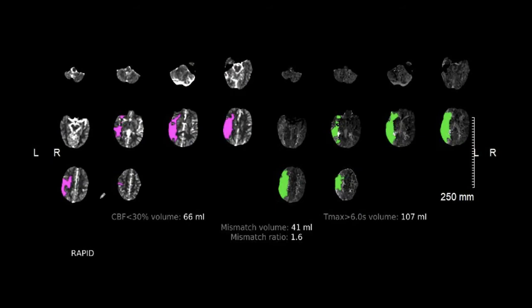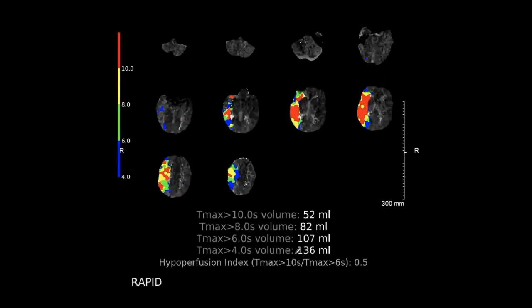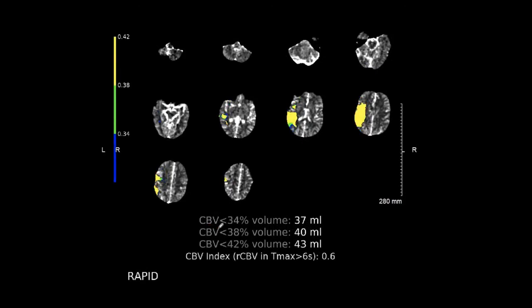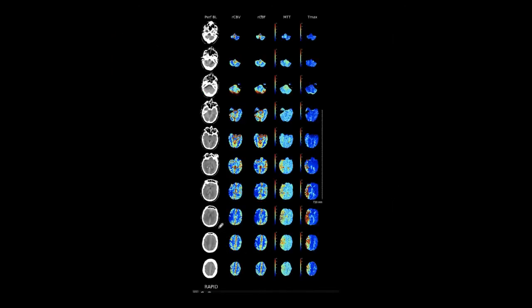So we already looked, you see the cerebral blood flow, and usually they calculate less than 30% over 6 seconds. It gives you the mismatch. So then once I know everything is what I should be trusting and there's no error, then the rest of it, you guys know how to handle this. Hypoperfusion index is given. And it always tells what it is. You know, it's a blood flow map or it's a volume. And the indexes are calculated because it's all computer generated.